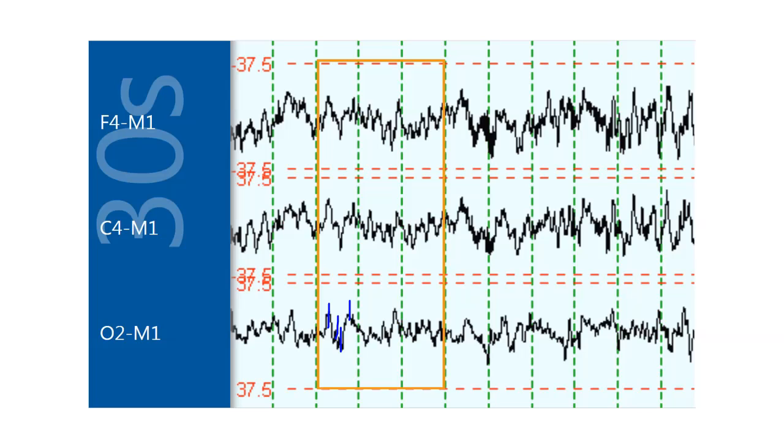Let's count our next one. So I count 1, 2, 3. These little tiny things I don't count. I count that all as 1. This one I count as 1 and that one. So this one doesn't actually meet our criteria for theta, but that's okay because it's not every second that meets it. It is the majority of the epoch that meets it.